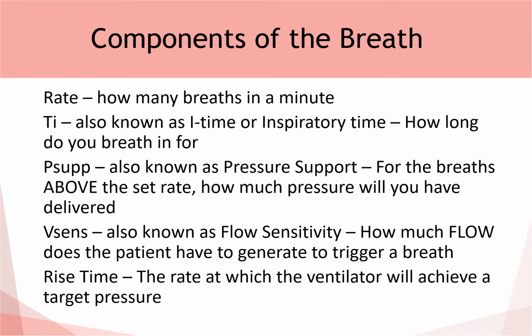On our ventilator, what's labeled P-sup is also known as pressure support, and this is for the breaths that are set above the rate. How much pressure support will you have delivered, or if you're just on a spontaneous mode like pressure support, it dictates how much pressure support you get above PEEP anytime a breath is triggered. That trigger is dictated by V-sense, also known as your flow sensitivity.